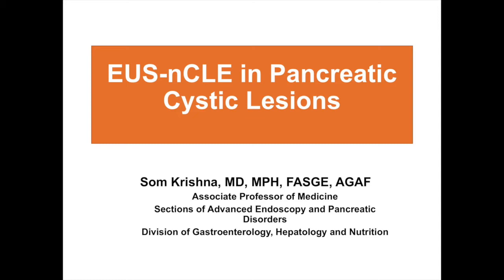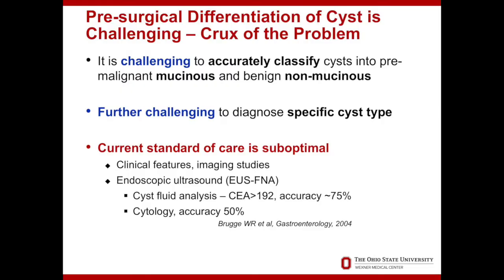Welcome to this discussion about interpretation of endomicroscopy images in the diagnosis of pancreatic cystic lesions. As you know, presurgical differentiation of pancreatic cystic lesions is challenging. It's challenging to classify mucinous from non-mucinous cysts using standard of care parameters. Further, it's challenging to diagnose specific cyst types.